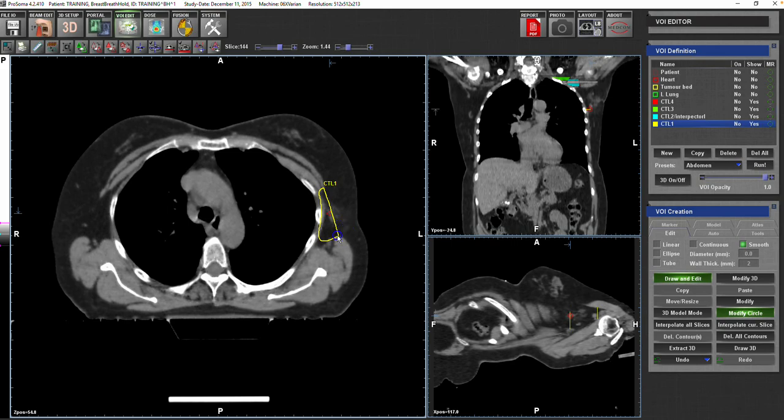Let's say that you see some soft tissue changes, or some fibrosis here or there. I would take it. So I usually make it a bit wider. Sometimes you see a seroma, I usually take it as well, but it's up to you. But I would consider seroma as a high risk, and I sometimes take it.